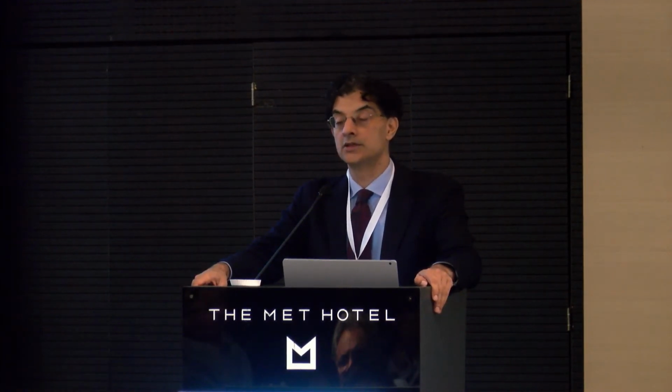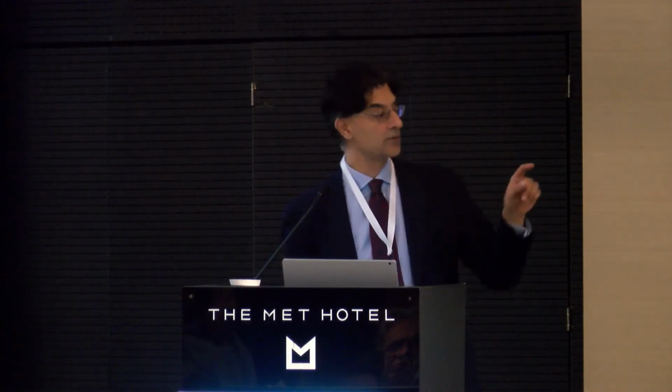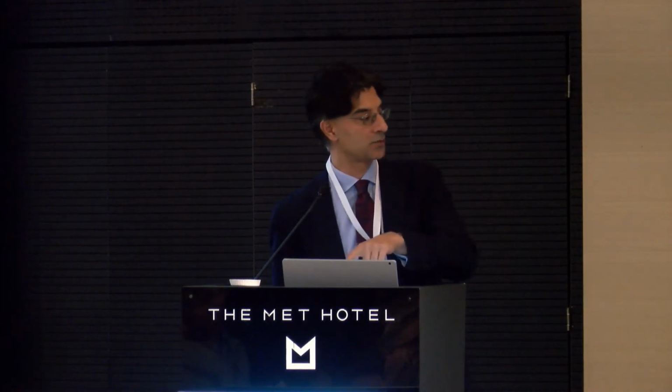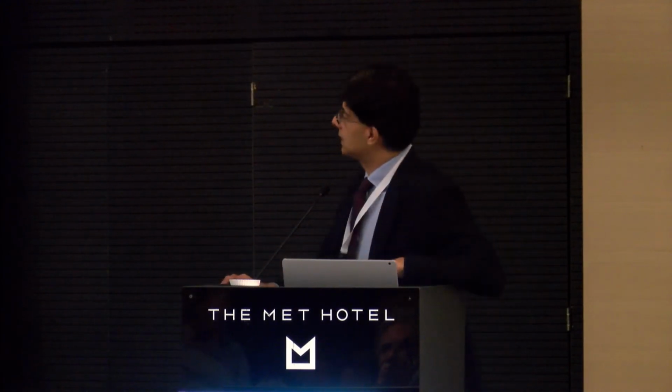The importance is the signs of type 2 CNV can be quite subtle in young patients, and you may miss it. Are you going to cover that? Signs of type 2 CNV? No. Oh, in which case, I'll show you a couple of type 2 CNV in myopia. Okay, so this is what I mean by type 2 CNV in myopia.